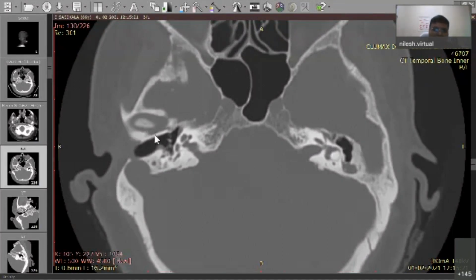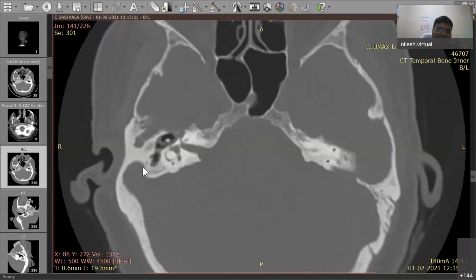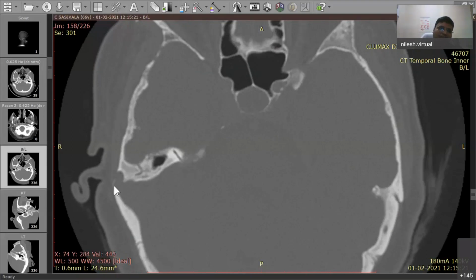So the start itself is dangerous in this case, because generally we elevate the tympanomeatal flaps. For the meatal flaps we take incisions here in the canal. There only you can puncture this sinus if you don't have a preoperative CT scan. So this is the first danger in this case. Second, the sinus itself is anteriorly placed, and third, it is exposed in the mastoid periosteum itself. There is no cortex at the confluence with the transverse sinus.